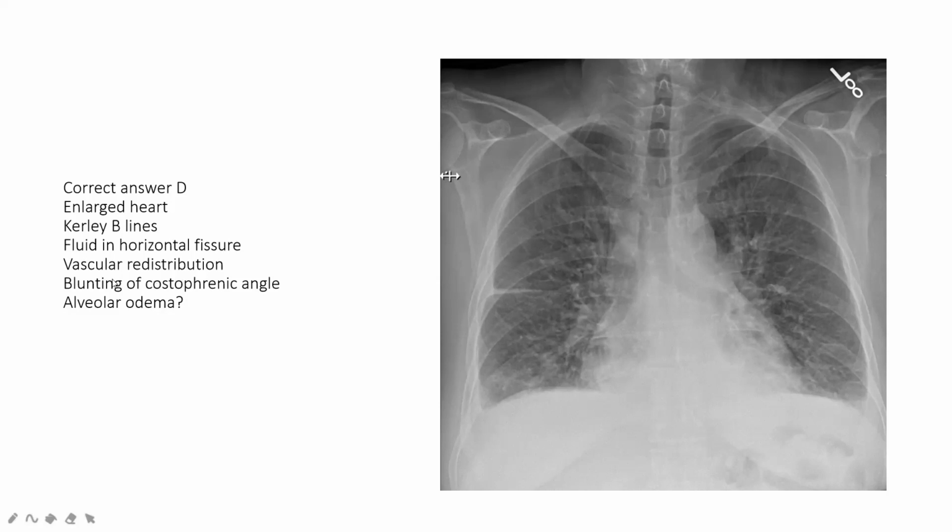The other thing that is very commonly seen is, as I said, blunting of the costophrenic angles. Coming back to that, the angles should be acute, but in this one you can see it's about 90 degrees or a little bit more than 90 degrees, actually an obtuse angle. And in this one also, there is an area of high density around it, and you can't really see the angle properly. So we've got bilateral pleural effusion as a result of the heart failure causing the blunting of the costophrenic angles in this case.